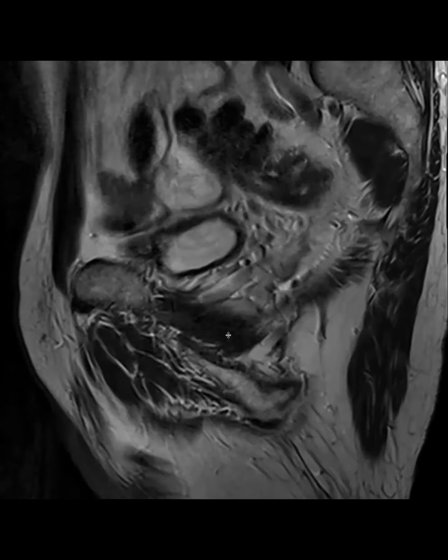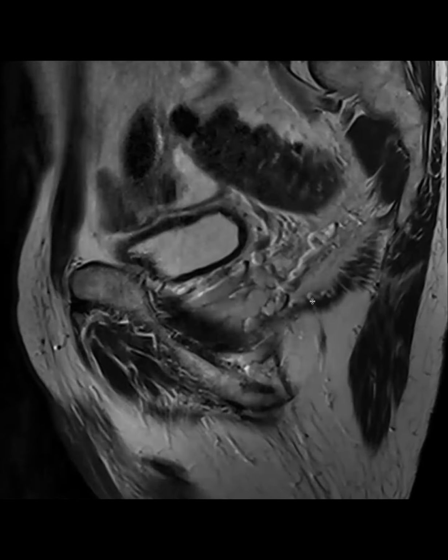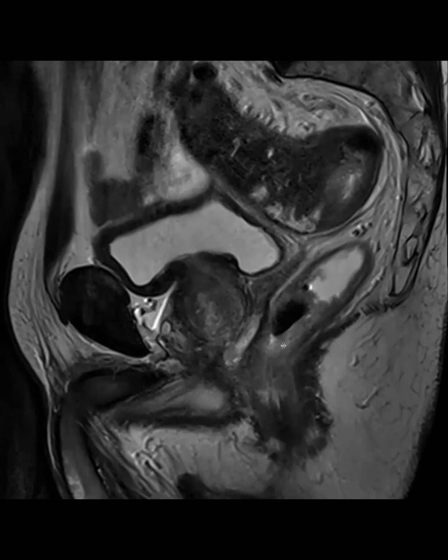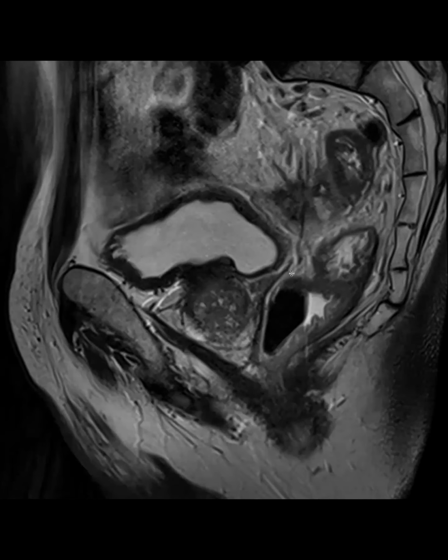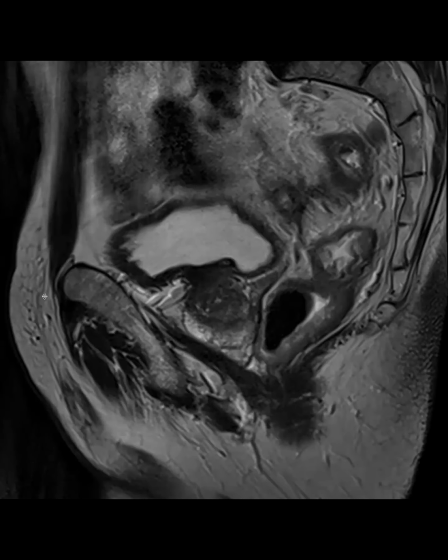Yeah, so even though the imaging was done for prostate cancer, there's a lot more going on. This turned out to be rectal cancer or sigmoid cancer, colorectal cancer. So it was a twofer. And as Aarti alluded to, there's probably right there a fistula. Anyways, keep looking.